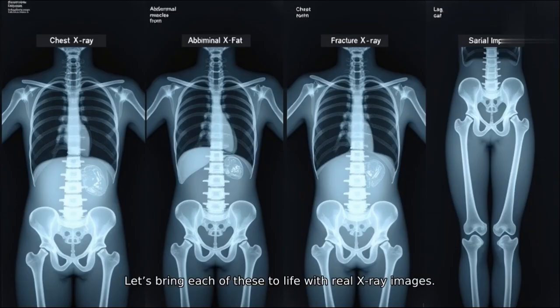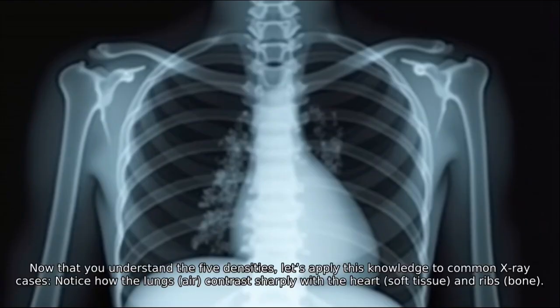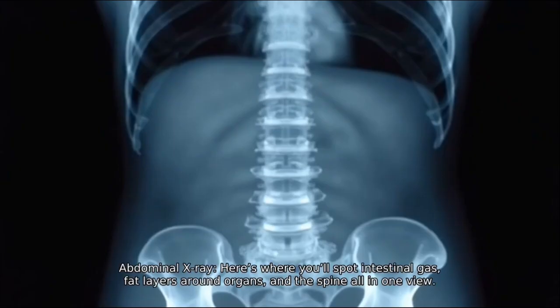Let's bring each of these to life with real X-ray images. Now that you understand the 5 densities, let's apply this knowledge to common X-ray cases. Notice how the lungs, air, contrast sharply with the heart, soft tissue, and ribs, bone. Here's where you'll spot intestinal gas, fat layers around organs, and the spine all in one view.